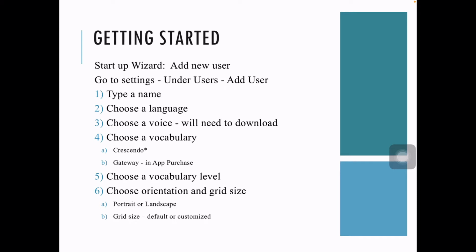So the first thing you have to do is set up your user. If it's the very first time that you have opened the app, it'll automatically bring up the startup wizard. If it's not, then you have to go to add a user. So let's go do that.